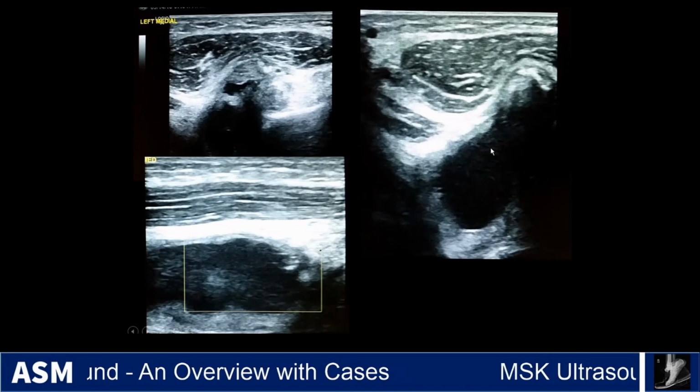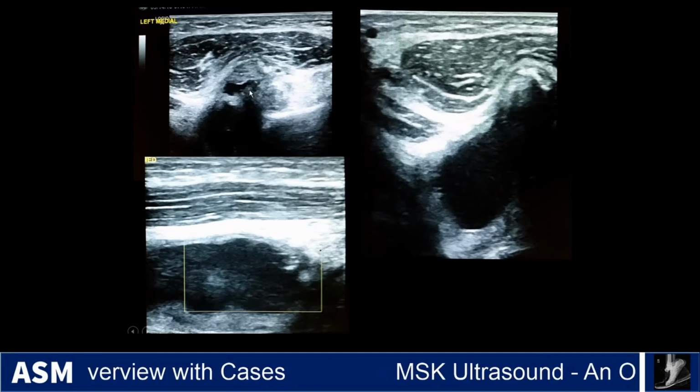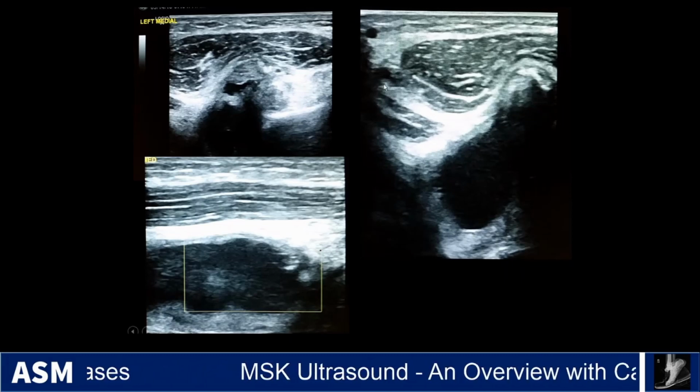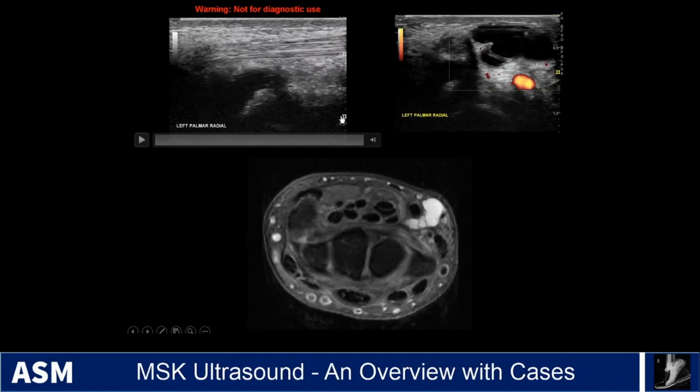And surgically, when they went in to take that exostosis down, they found an adventitial bursa. So these patients may get adventitial bursitis that can cause pain as well, and can impinge on tendons and nerves and things like that. And so the ultrasound can be helpful to tell these cartilage caps from adventitial bursa.